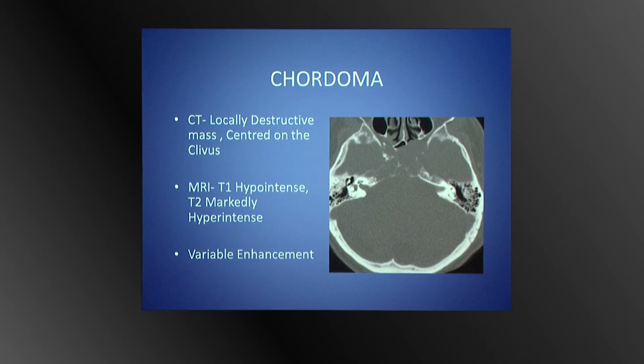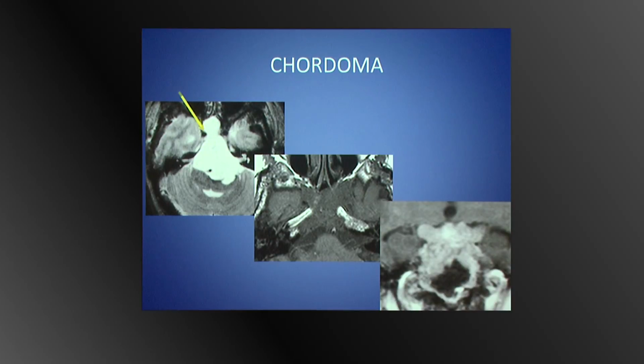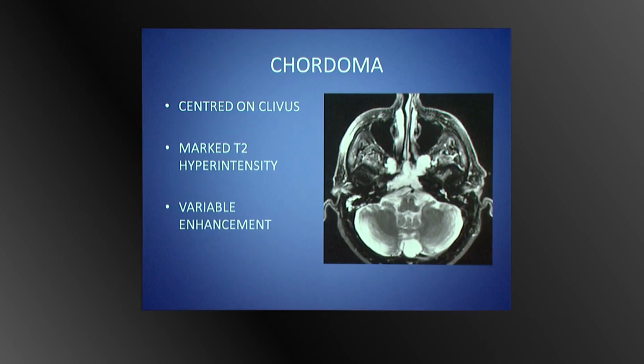And they're often supposed to have this honeycomb type of pattern of enhancement, which I must admit I've seen pretty rarely or infrequently. Not that we've seen too many of these. So central position is important. Remember, the CT could be anything, but it just illustrates what it may be rather than what it is. Very bright on T2. Soft tissue outside the apex, and then variable enhancement.